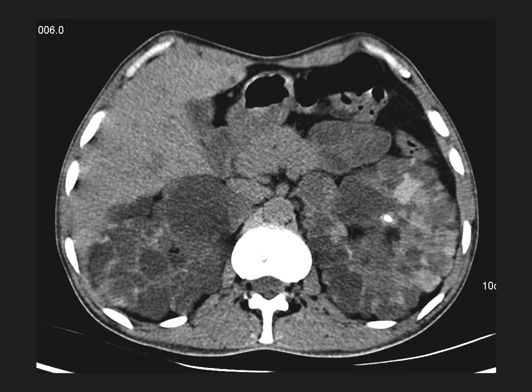All right, pause the video if you need more time, but what we're seeing here are two massively enlarged cystic kidneys. You see them on the patient's posterior, at the bottom of the picture, and you just see two massively dilated kidneys, each filled with cysts. This is clearly a polycystic kidney disease.